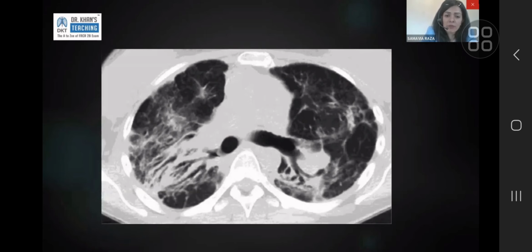And those of you who have seen it once will always remember what it looks like. And the way to remember it is when you have a CT chest and it's a supine scan, what you want to look at is when it's sarcoidosis, it's upper to mid zones, and it looks like somebody has taken the bronchi and they have pulled them back. So like if somebody was standing in front of you and facing the other way and you took their arms and you pulled them back, that's how it looks when you look at the lung. It looks like there's somebody pulling it back and laterally. So the bronchi are going to curve back and curve laterally.